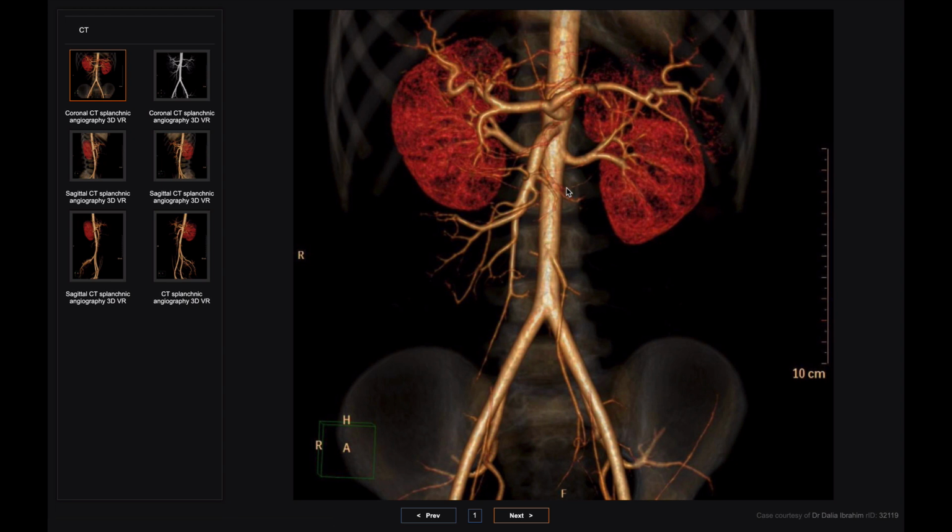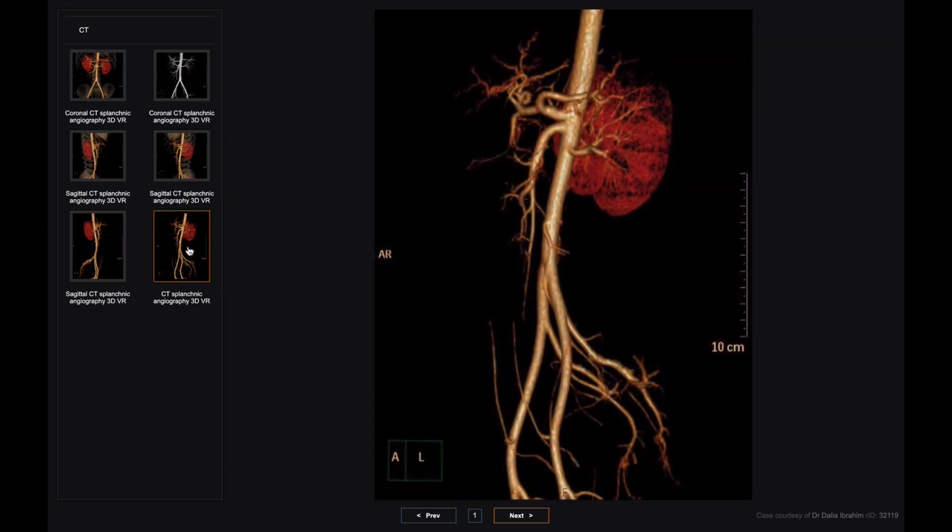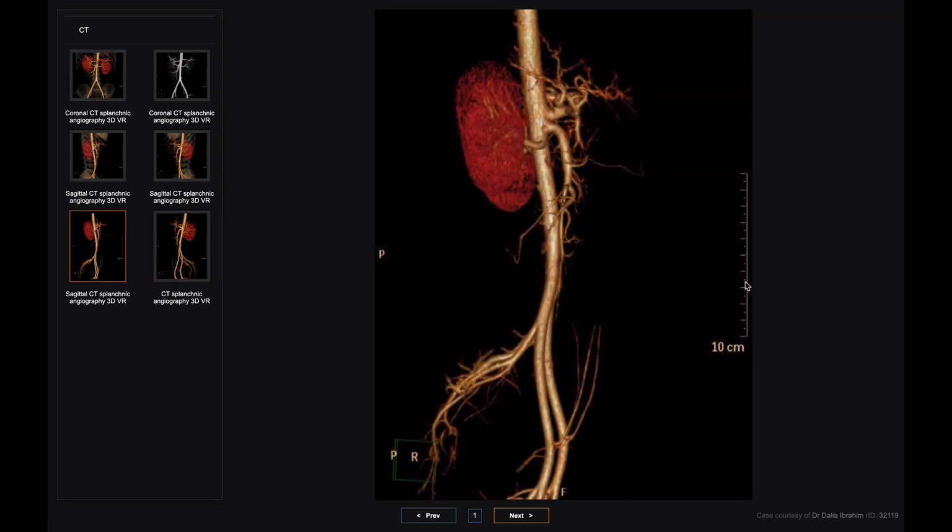And with the data that we get from the CT studies, what we can do is run it through some software that picks out the highest density areas and converts it to an image like this, which provides a roadmap of the vessels in a 3D format. And this then allows us to plan procedures for implementing devices within the vessels. And it's quite useful to be able to rotate these images and look at them in different angles.